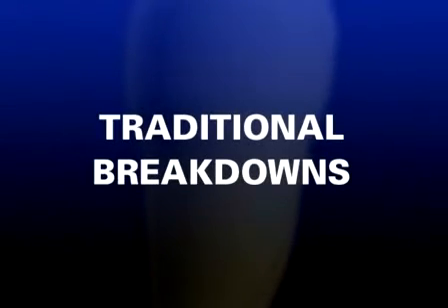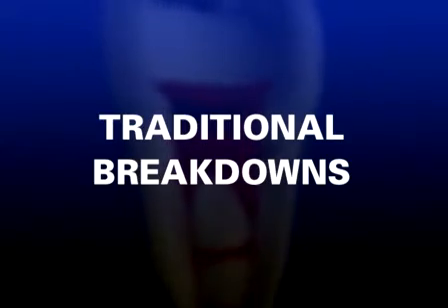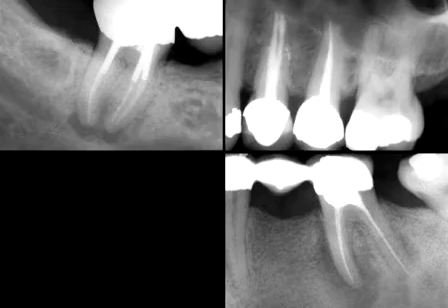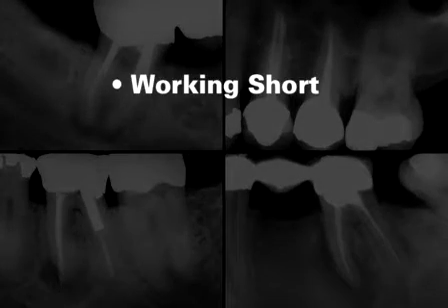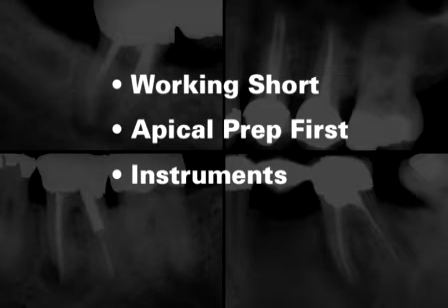Failure to respect and appreciate the biological and mechanical objectives of cleaning and shaping increases frustration and predisposes to needless complications such as blocks, ledges, apical transportations, and perforations. These iatrogenic events can be attributable to working short of the radiographic terminus, attempting to negotiate and prepare the apical 1/3 of the root canal first, the instruments, and their methods of use.